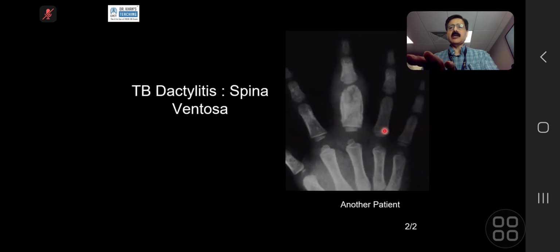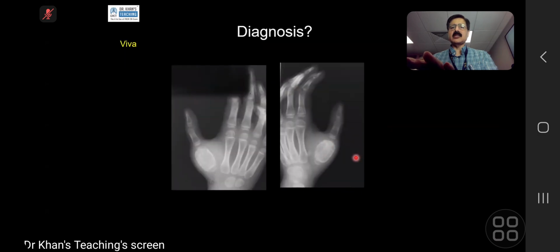By the way, syphilis dactylitis is a differential, though I did say that this is an aunt mini because of the expansion of the medullary cavity. Enchondroma will be a lucent lytic lesion. This is not a lucent lytic lesion.